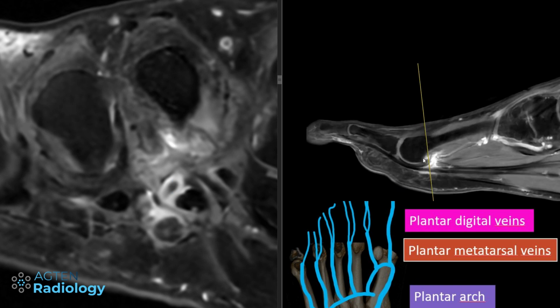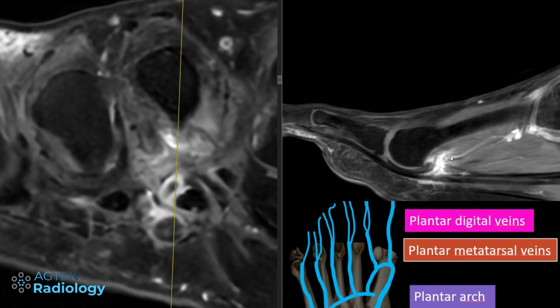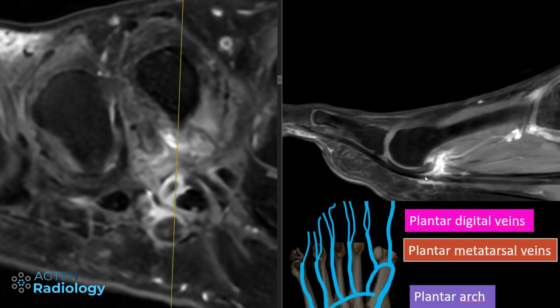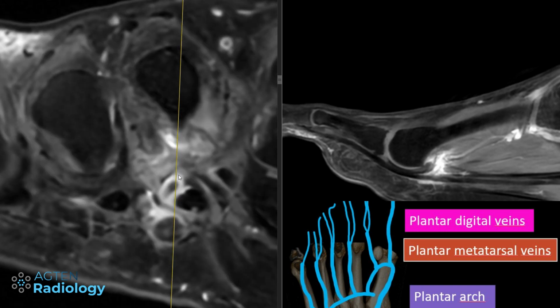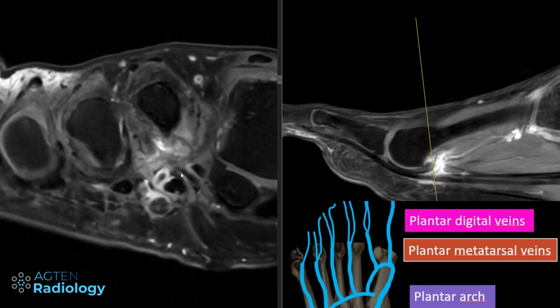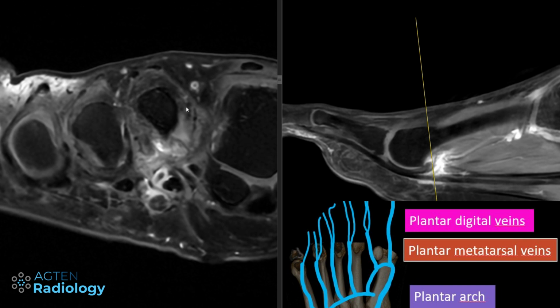not good on the sagittal, and you can easily just call this, I don't know, maybe joint capsule injury or something like that. But I think the key is here, this is not a problem of the plantar plate or of the joint capsule or of the joint for that matter, but it's actually a problem of this thrombosis here. So this is a very tricky case, I give you that, but yeah, we also need to solve tricky cases. And these thromboses in the smaller joints are not easy, first of all, and they're not just limited to this.